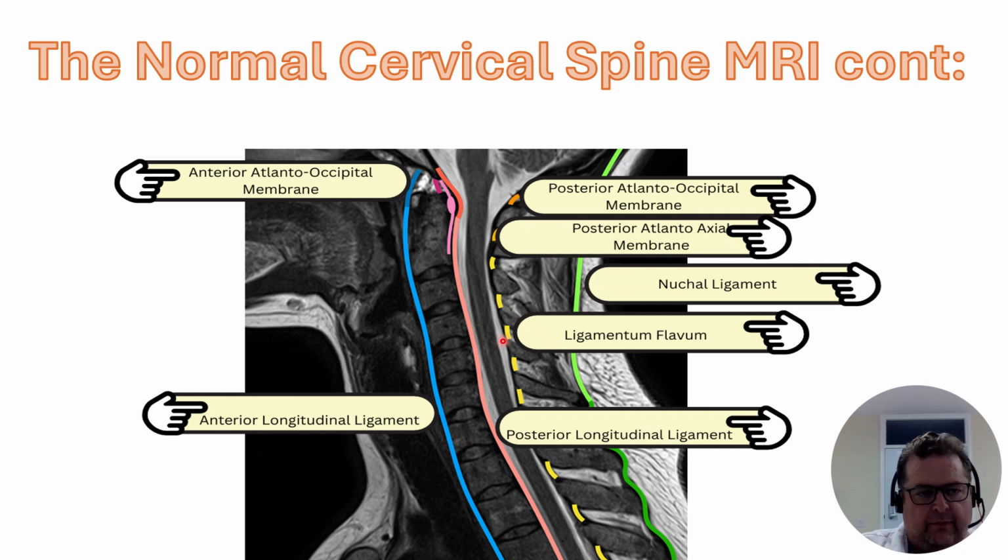And when we're looking at the MRI, I use the ABC approach. So we have alignment. So we're looking at the vertebrae. B is for the bones, the vertebrae signals, the disc signals. C is for cord. And then I add in the ligaments, so the anterior longitudinal ligament in blue, the posterior longitudinal ligament in pink, and the ligamentum flavum in yellow.